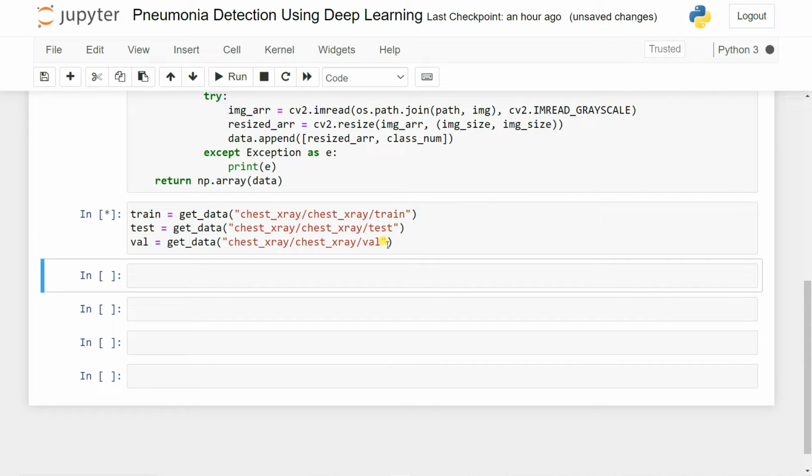Well, okay, now you can see here it loading the test images, training images, and also the validation images inside my directory. Now we have the data visualizations and the pre-processing task. Now what I can do is simply plot our data set, to see how our data set looks like.